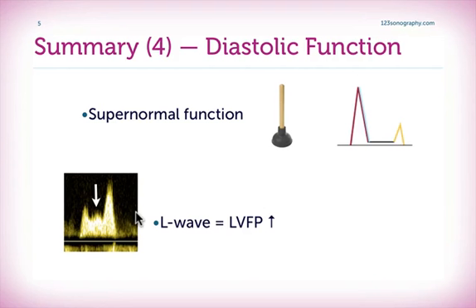And look out for the so-called L wave, which is a third peak between the E and the A wave, which denotes elevated left ventricular filling pressure.